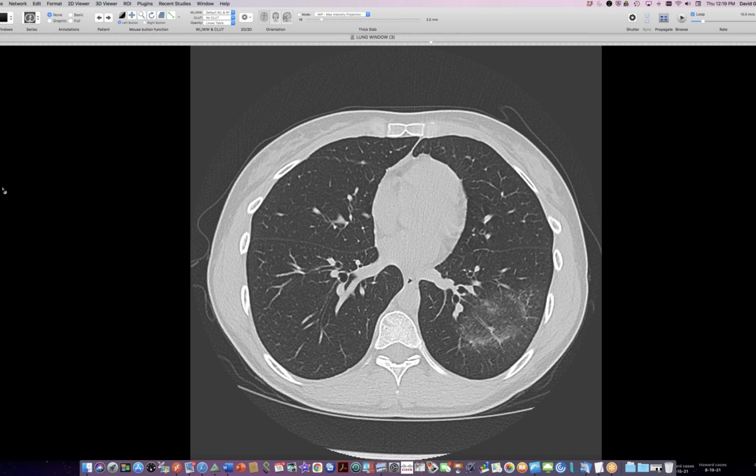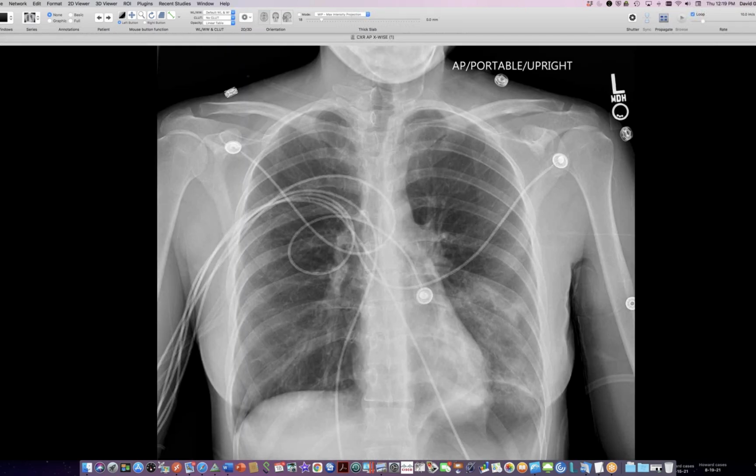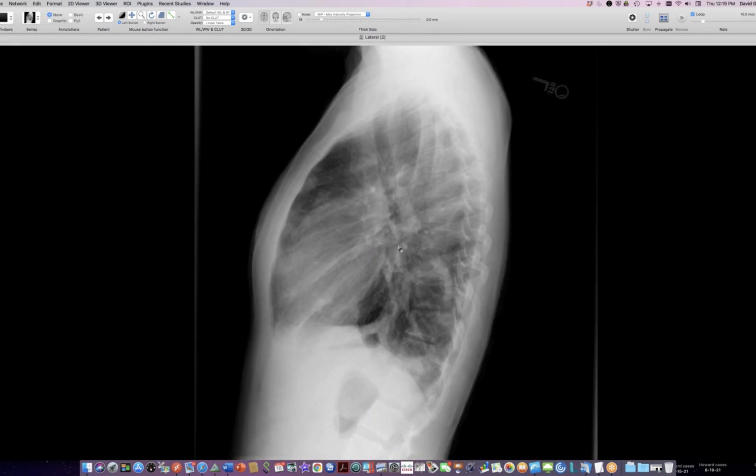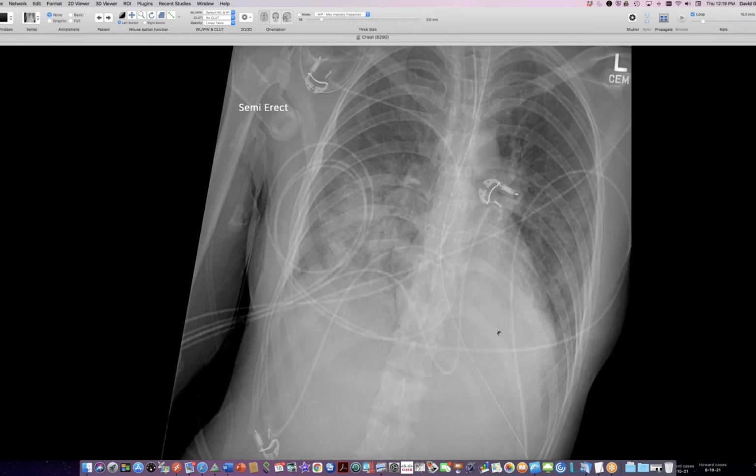But she continued to be ill, and she came in more recently, this is the beginning of November, with more consolidation in that left base. And here it is a day or so later, and you can see that again, there's this consolidation down here. Things got much worse suddenly. So let me skip ahead to a radiograph.